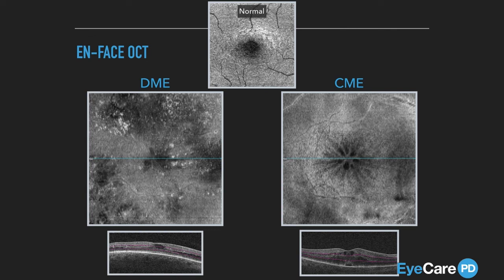This is a way that you could use your current existing technology, your OCT device that's in your office right now. You could look at the images en face, and instead of just looking at them in these qualitative cross-sectional images, or perhaps quantitative maps, which are not on this slide, you could look at them en face, as you see here and here, and that perhaps could provide an entirely different perspective and maybe assist with diagnostic accuracy. So looking at the technology in a different way is important. You've got this in your office right now.